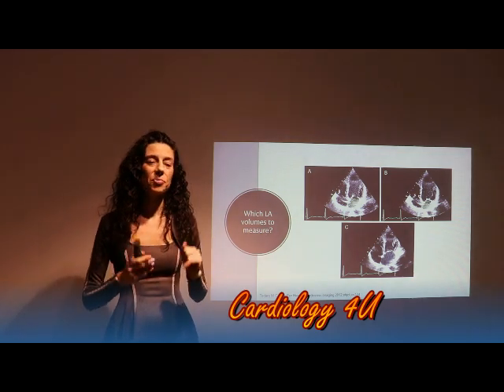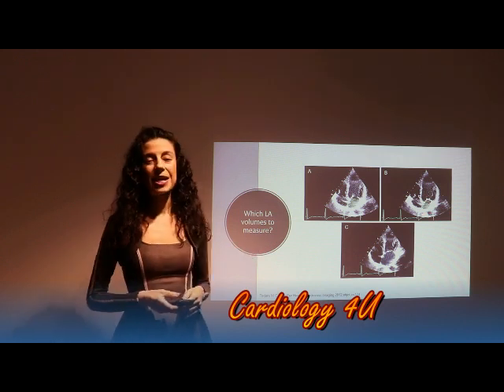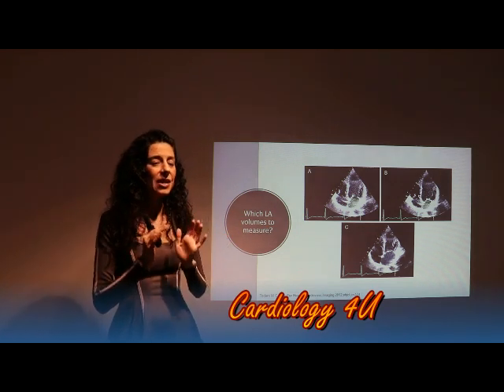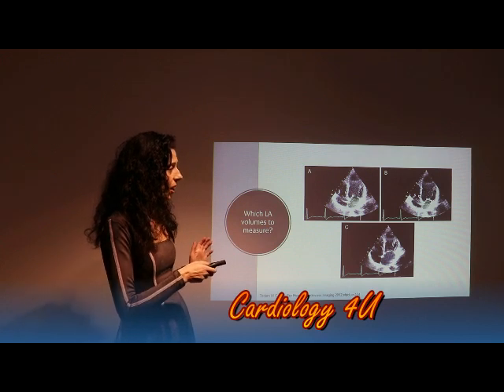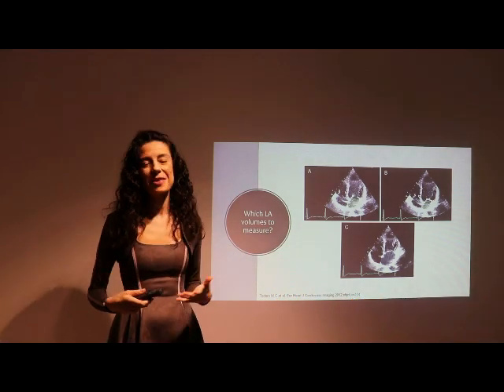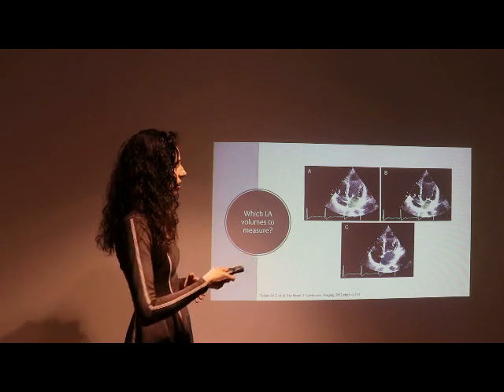Another very important volume is the minimal left atrial volume. It happens, of course, when the volume is at its lowest stage, and this is when the left atrium has emptied all its volume, it has to be emptied in the left ventricle, and this happens in end diastole.